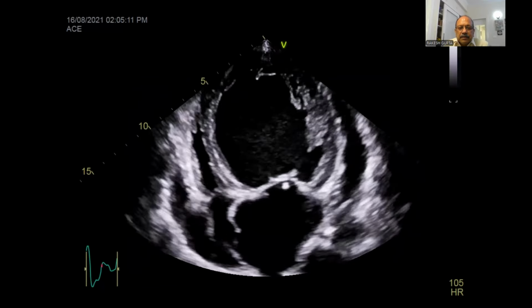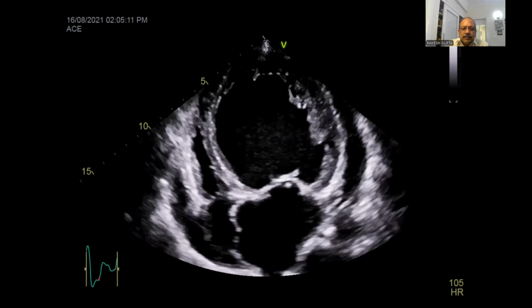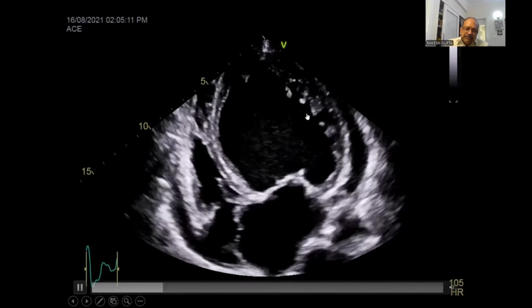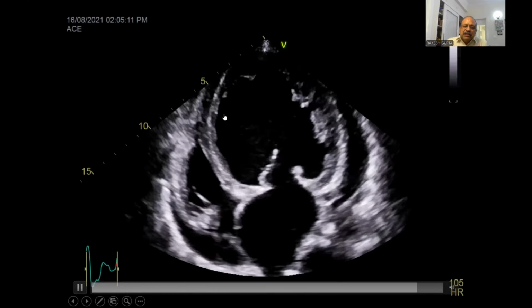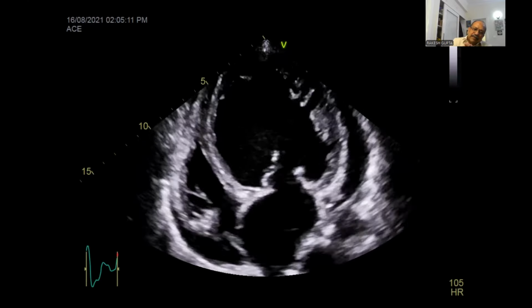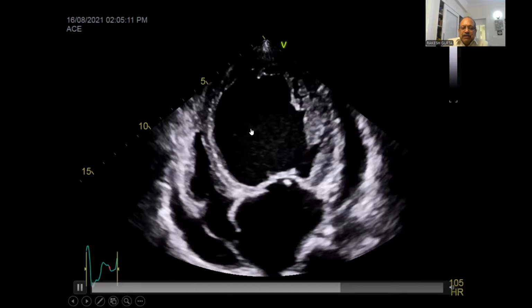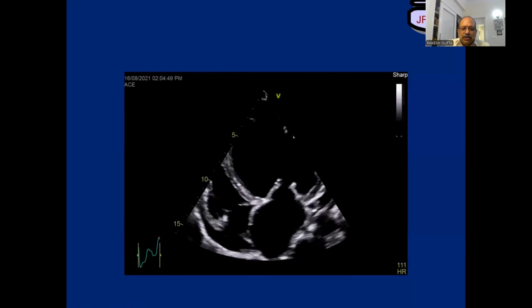Now see this segment. This is known as non-compaction. We'll be talking about this when we talk of cardiomyopathy. This is a dilated LV, and look, there's hardly any thickening over here. This is all sliding motion, as if something is sliding over the heart. And when you happen to see this, then possibly we think of dilated cardiomyopathy. I'll show you a few more pictures of this.